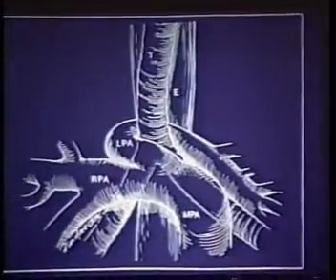In the axial projection, similar findings. We can work our way up, ascending aorta, descending, and beautifully follow the tracheobronchial tree throughout. And again, we see the left subclavian originating from the remnant of the fourth arch posteriorly. Again, a similar pattern to double aortic arch with left arch atresia. It's the esophagram that may give you a clue.